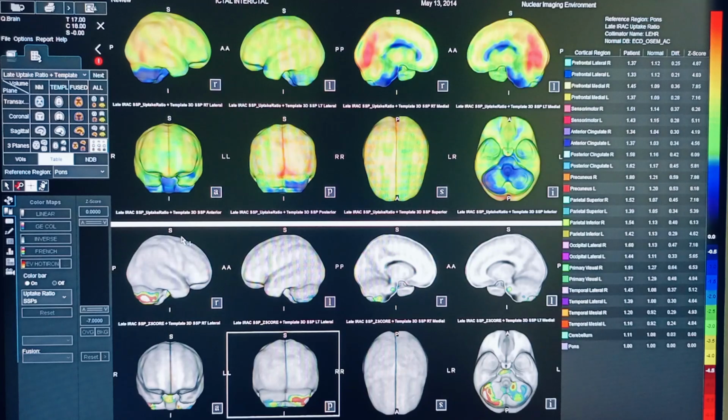Right? Any question? No. So this page is required to be given to the patient. Yes. So this is with the quantitative information, and the quantitative information is calculated from the patient data as well as the normal database which this software has, and the difference gives the abnormalities in terms of Z score.